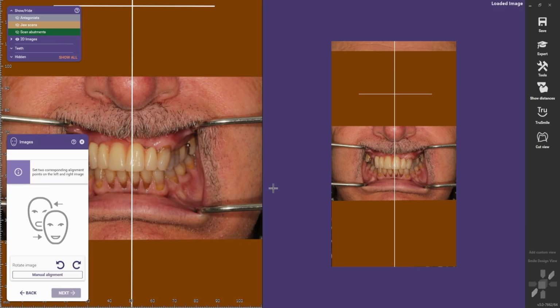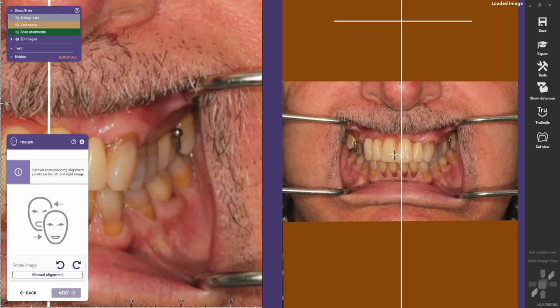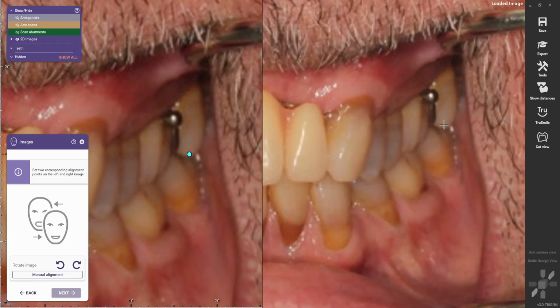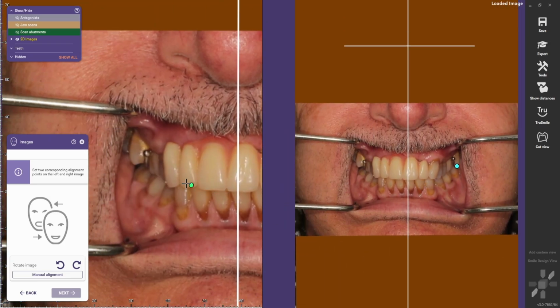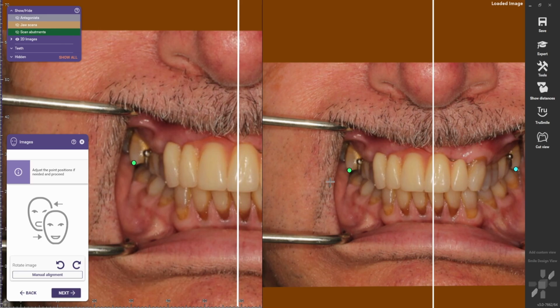And now I use the same image. I edit the image to hide the eyes, for privacy reasons, and I've created a line where the pupils are. I created the midline, the ideal midline for these patients. Usually at this stage we would align a picture with the patient smiling, but I don't have a good picture of the patient smiling, and because I don't have a pre-op, this is the best picture to have a reference of the teeth length.